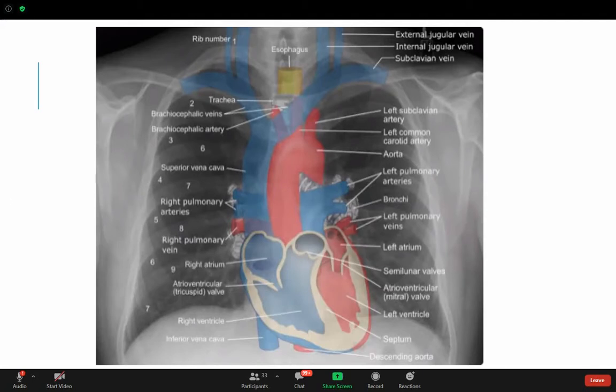for the major organs as well as vessels, which in a black and white image like an X-ray may not actually be very clear. But when you see a bulging or whitening or ossification, you may expect where they are coming from. So you can see the cardiac silhouette here. This is the right side. This is the left side. The great vessels area, basically all in the center, as well as the trachea and the esophagus. You see the branches of the venous system.